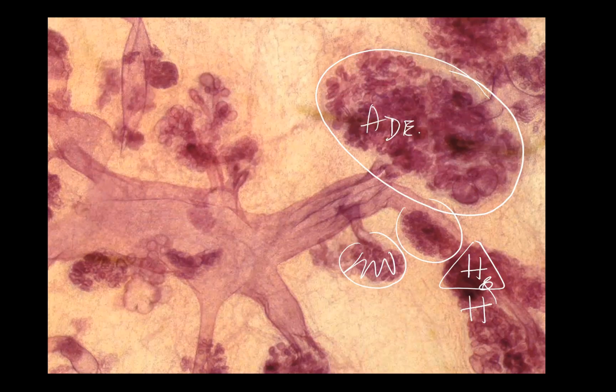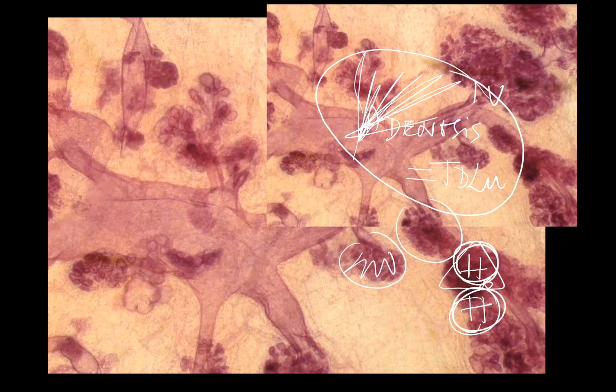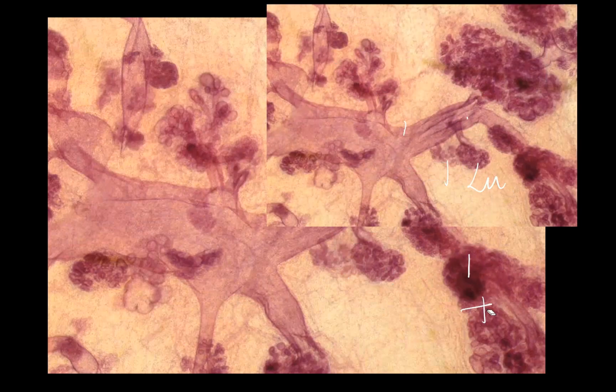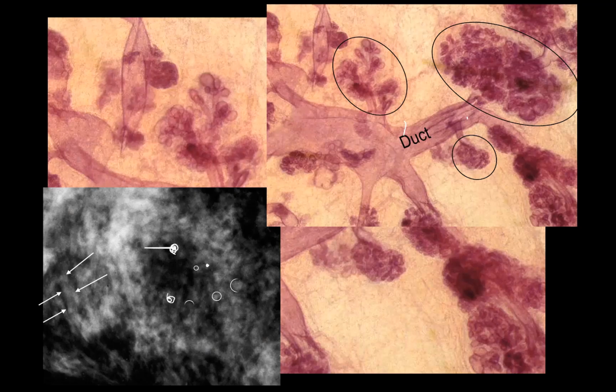That's why we call this adenosis. What is adenosis? One of the hyperplastic breast changes where there is a hyperplasia and hypertrophy of the terminal ductal lobular unit. And that's actually the pattern 4. And when you image this one, you are going to see the varying sizes of the nodular densities. This is tiny, this is bigger, this is even bigger, and so on, corresponding to that. And here are the ducts as well.